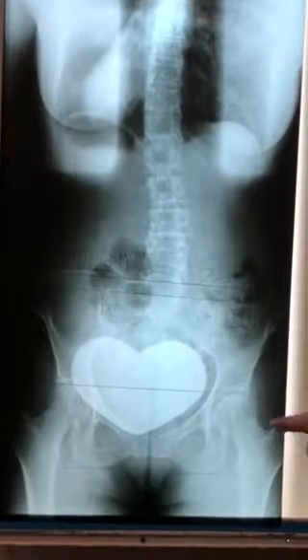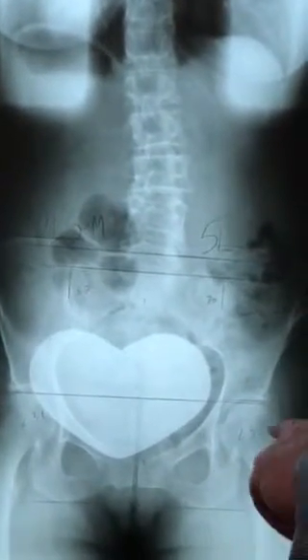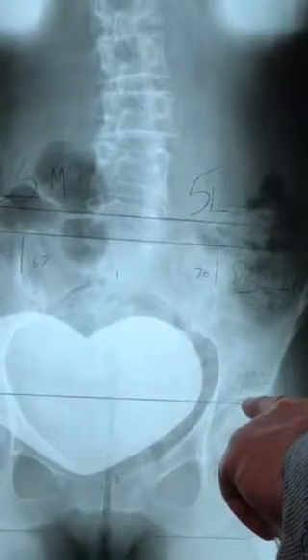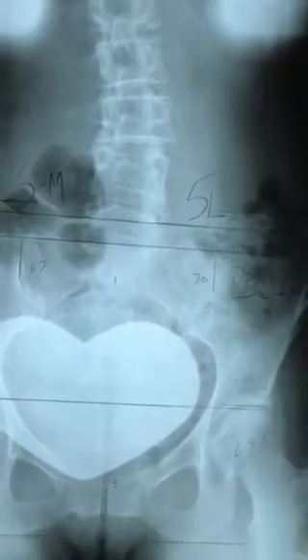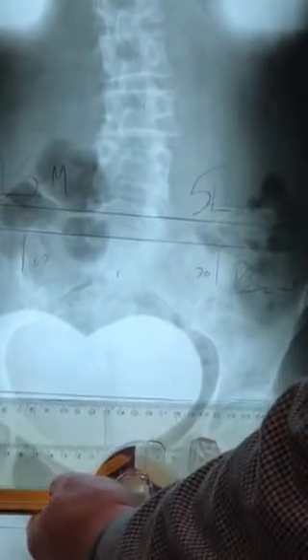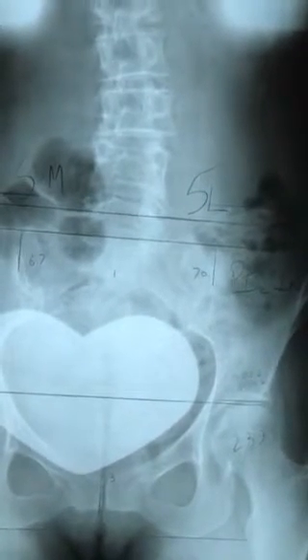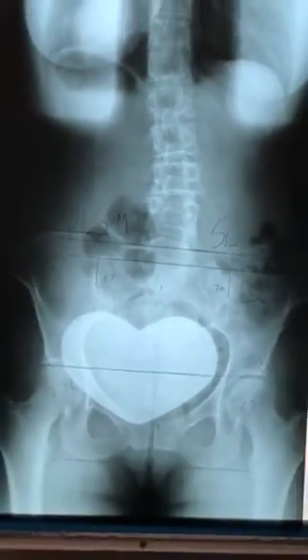And the last question is, we're going to ask you to use your parallel and measure the short leg. You're going to measure from the top of the femur head to the little line drawn across the top of the short leg side. That short leg side is from the top of the high side drawn straight across, and you're going to measure that, and that's going to give you your measured short leg deficiency. So that's a very quick review of your Gonstead Analysis Lab Final for X-rays.